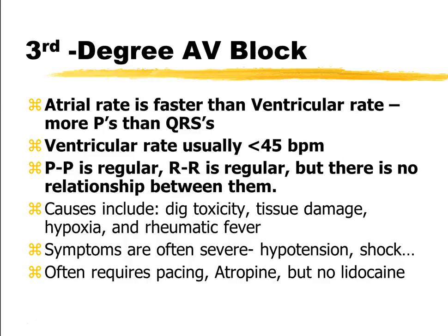So let's take a look at this on the strip. But again, what could be the cause of this? Several different things. This is kind of bad though, because your ventricular rate is slow. They are going to be symptomatic, and they're not going to feel good. So if we see this and they have hypotension, they look like they're not getting perfused, we need to intervene. Again, atropine might work. No lidocaine, because that's an antiarrhythmic that has a slowing component to it. We just don't want to go any slower than we're already going. We also could try transcutaneous pacing to speed that up.